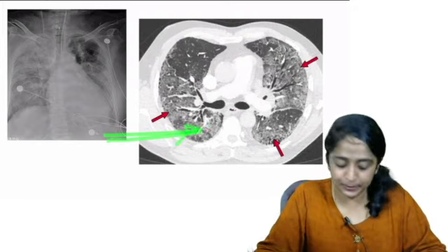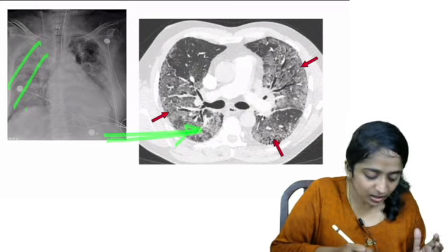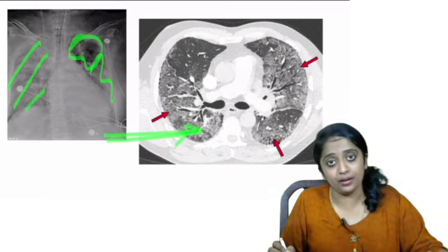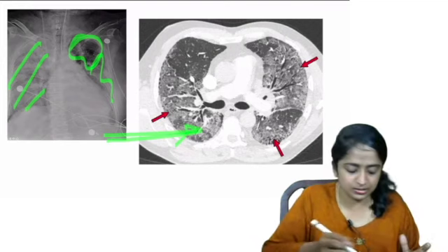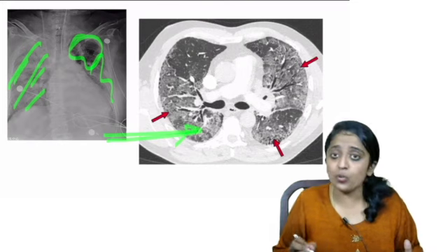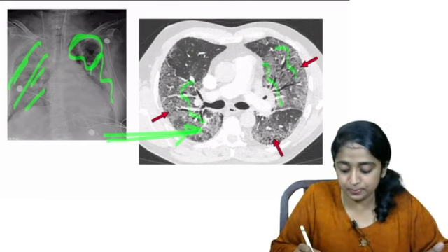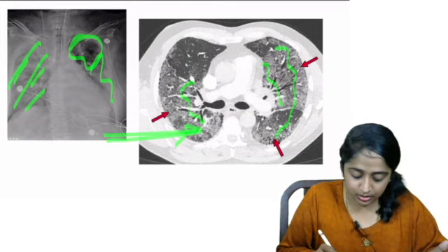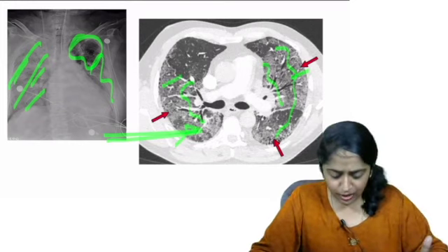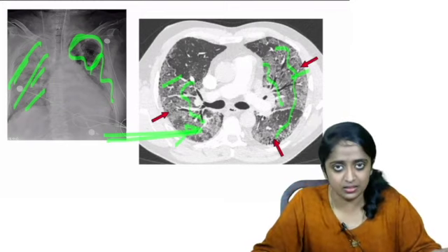What is typical here? In the lung, there is diffuse opacity. Right lung is almost gone. Left lung, what am I seeing? Mild sparing in the upper lung zone. So there is diffuse opacity, both central and both peripheral. Okay? And on CT, what am I seeing? The same thing. I'm seeing central manifestation as well as peripheral opacity in terms of ground glassing and in terms of crazy paving. Now, can I just brush it off as saying, yes, diffuse opacities?